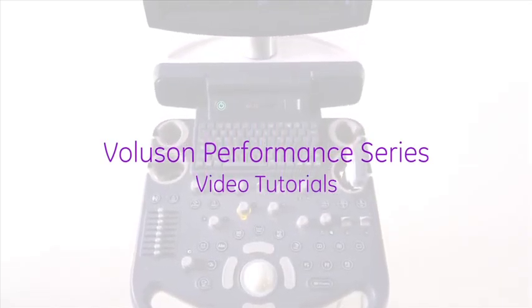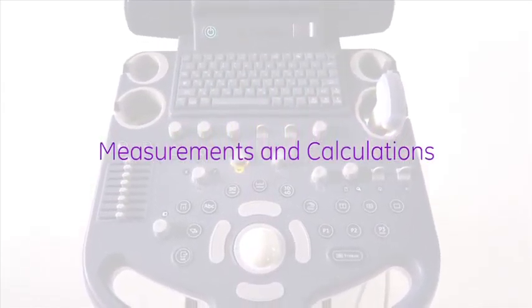Welcome to the Voluson Performance Series video tutorials, Measurements and Calculations.